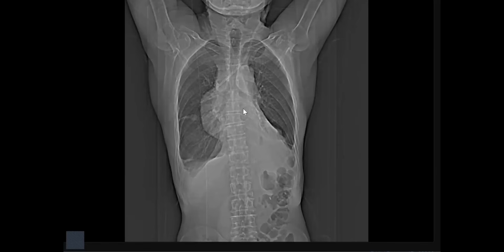But correlation with the history. I give you a history. The history given by the examiner is very important. This is a dialysis patient, but presenting acutely. Not every case with dialysis needs a CT scan. I know here some blunting of the angle and here also, so we have to put a possibility of effusion. With the mediastinal hematoma, it can also have bilateral hemothorax.